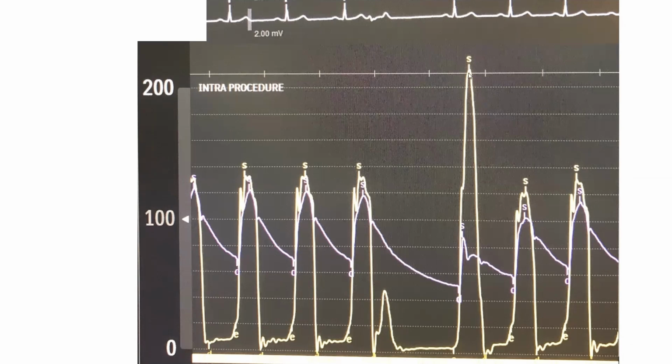So you don't get just an increase in gradient, you get a drop in flow, dramatic drop in flow. So you get an increase in gradient and LV pressure, but a drop in aortic pulse pressure. And again, anytime you get an obstruction in dynamic LVOT obstruction, you develop that spike and dome morphology. So the Brockenbrough is not just an increase in gradient, it's a drop in pulse pressure of the aorta. It's also spike and dome pronounced aortic morphology. Compare this to that or to that. It's also change in LV morphology, as always, late dagger.